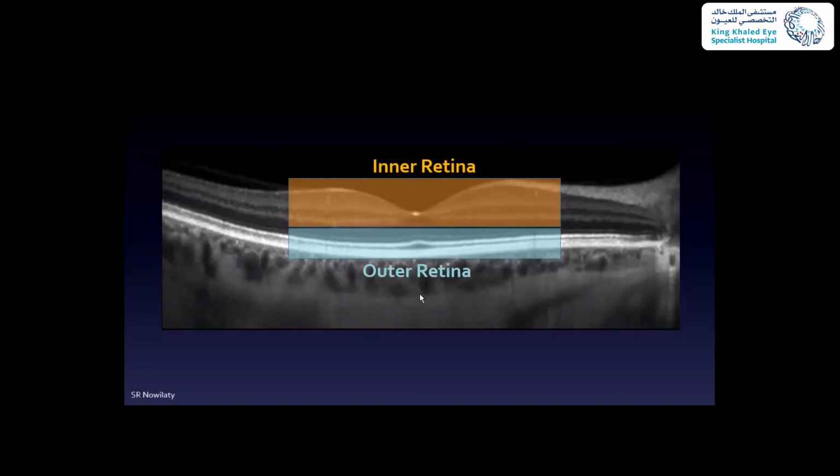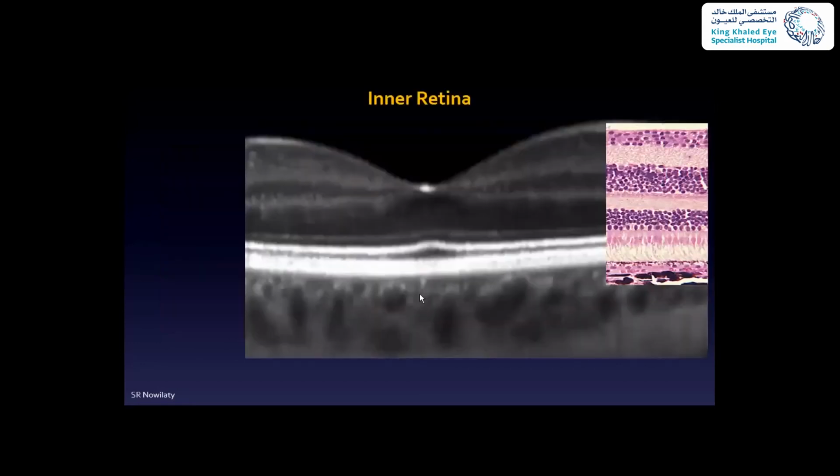Now let's see how this works on an OCT. Here I juxtaposed a histologic slide of the macula. How do you know that I'm dealing with a macula? I think the residents who took the anatomy course not long ago remember that you can tell if the slide is from the macula or not by looking at the number of ganglion cells.